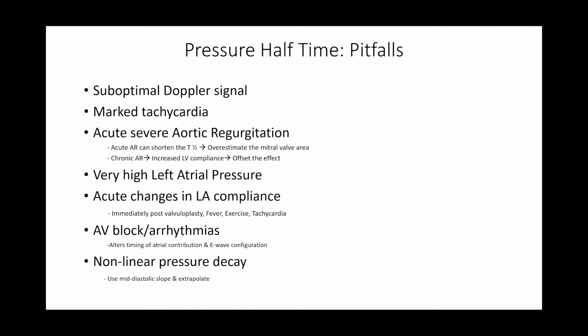So, pitfalls. Of course, you need a good Doppler signal, because if you don't have a good trace, you cannot trace your pressure half time. If the patient is tachycardic, it means that your diastole will decrease, and it will affect your left atrial compliance as well.